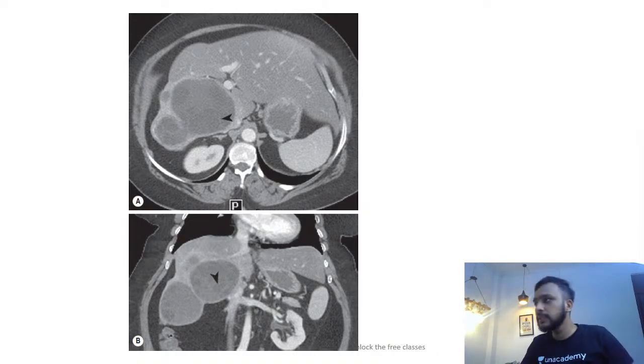Very good, Nimisha Mondale. We are able to see a few lesions which have water density. Basically these are your cystic lesions.